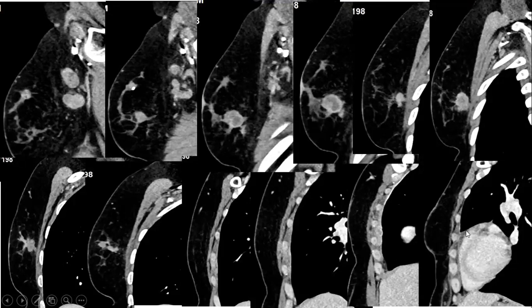And if you go even here from the left side, this is the intercostal on the left side. When you come to the right side, look for this focal thickening and enhancement, it signifies that there is what? There is chest wall involvement. Not only the pectoralis is involved, but also there is adjacent chest wall involvement.